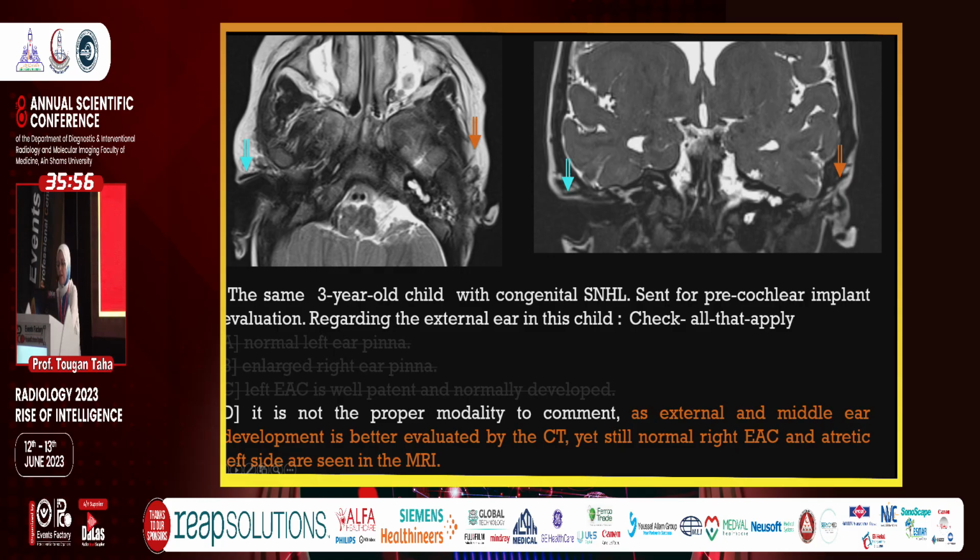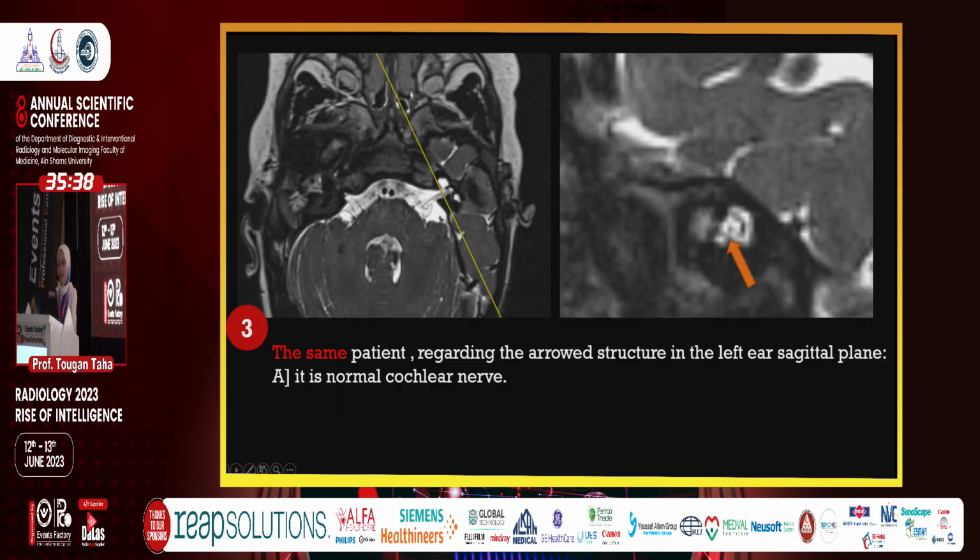The correct answer, it is not the proper modality to comment, as the external and the middle ear development is better evaluated by the CT, yet still normal right external auditory canal and the atretic left side are seen in the MRI.